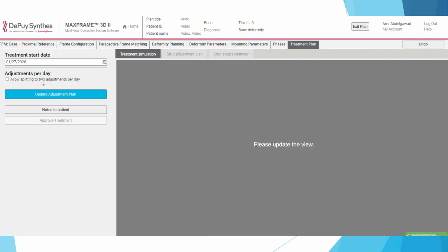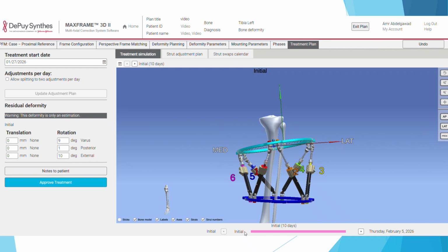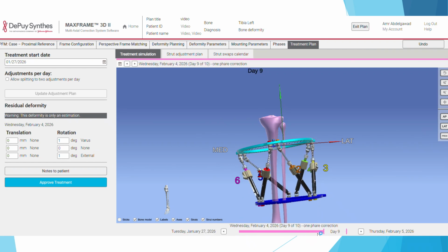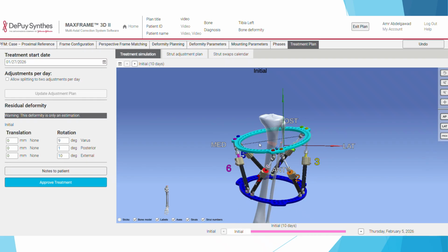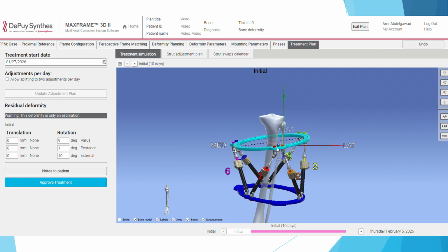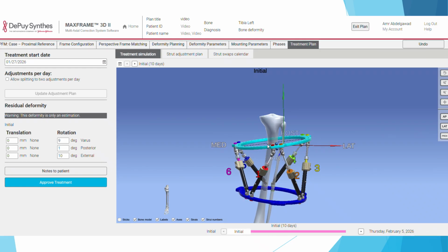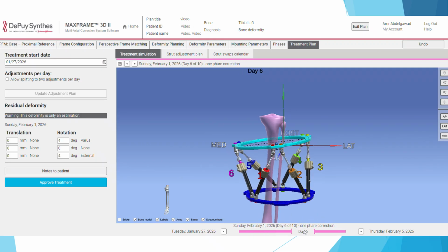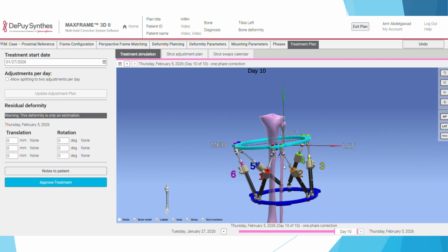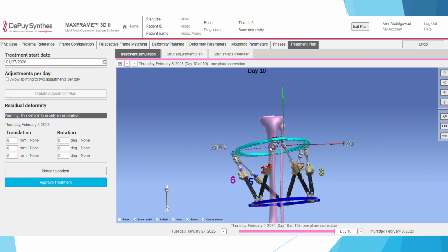You get to the treatment plan, and this is my treatment day. You go here and move it, and you see the changes here. Because we put the point here, the computer already shows these areas as overlapping. They're not really overlapping, but that's what the computer will do to make sure that you're correcting from the concave side, and it will end exactly here on the same edge.